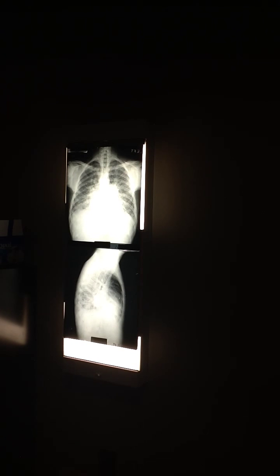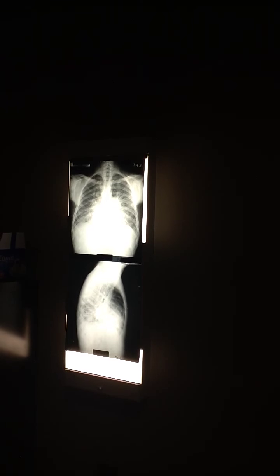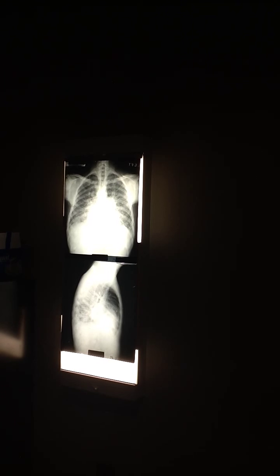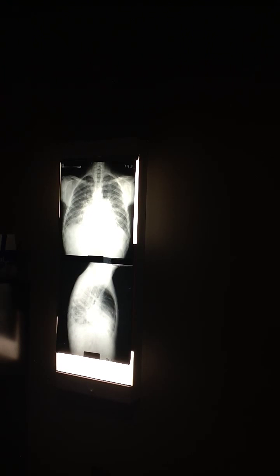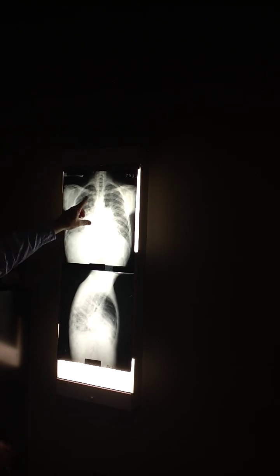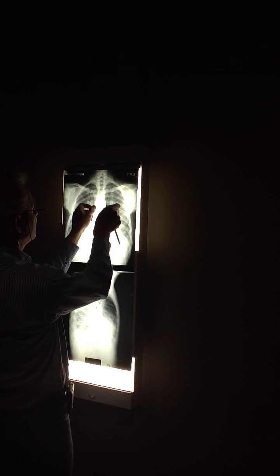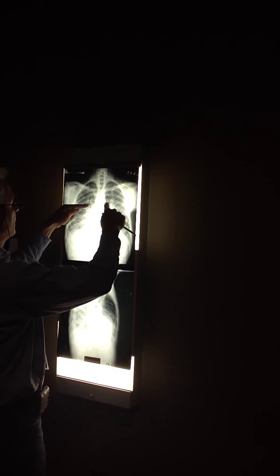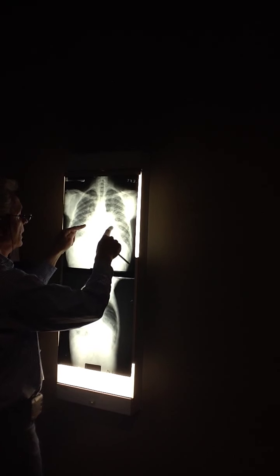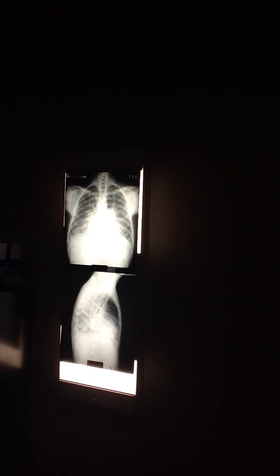And three, pulmonary edema. That's classically what they indicate. Cardiovascular or non-cardiovascular related. Now this patient's is cardiovascular related because we've got the prominent upper lobe veins, which is the Viking hat sign, going up like this. Those are those prominent, very distended veins. We've got big hilar areas. So something is backing blood up into the lungs.